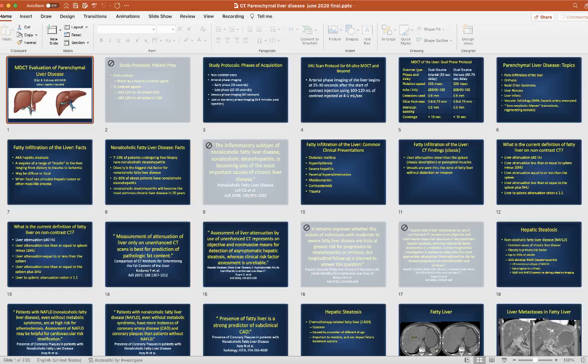One of the things we look at is the shape of the liver. The liver should be smooth, bordering against the abdominal wall. If this distance is increased, typically underlying parenchymal liver disease is going to be one of the causes. You're going to look carefully. Obviously, if you look at the spectrum of liver disease, particularly as you get to patients with cirrhosis, then you're going to be concerned: is it possible the patient could have an occult neoplasm like hepatoma? So then you need to look very carefully.